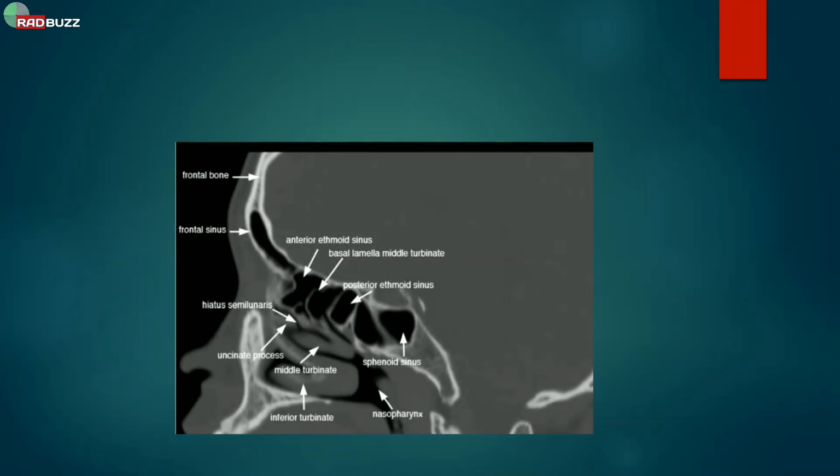This slide I just put to show you anterior ethmoid, middle one, and posterior one in one go, and the draining areas here, here, and posteriorly. Here we can see the middle and inferior turbinate on lateral images as well, so that you can have an idea like this thing is draining here, somewhere here, this will drain into it as well, and that will drain all the way into the superior and middle turbinates. That's the draining path. Very small areas or the linings which drain these.